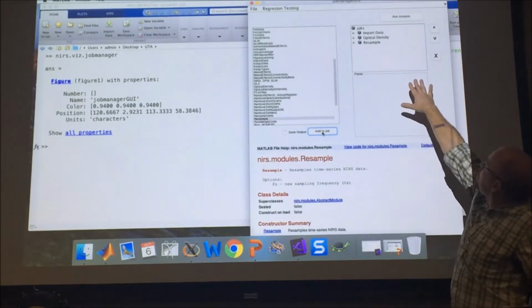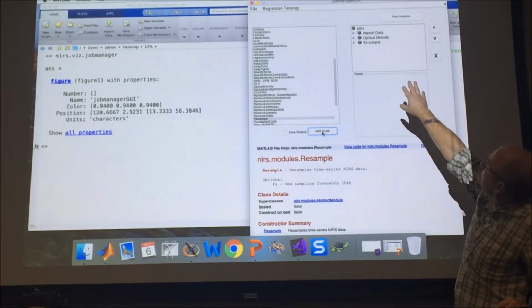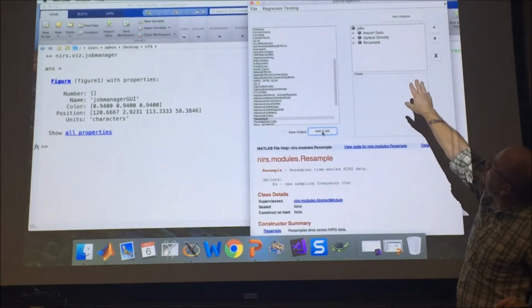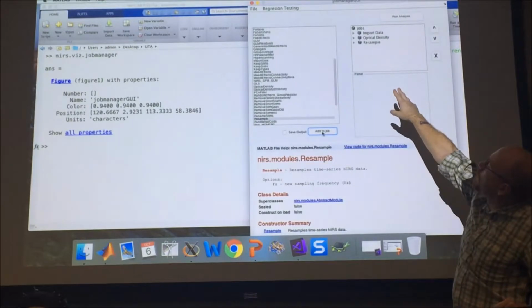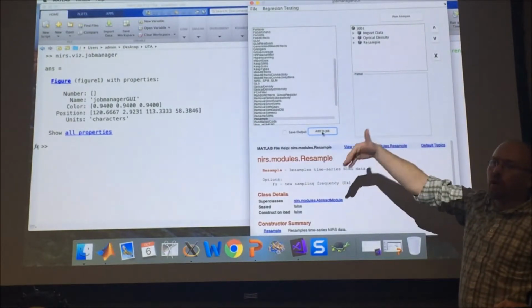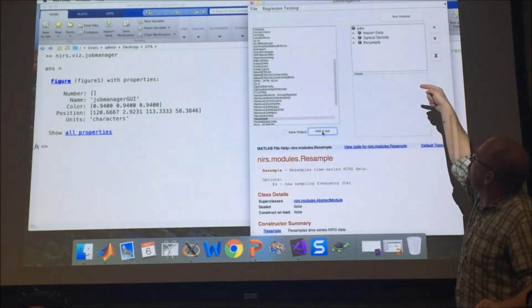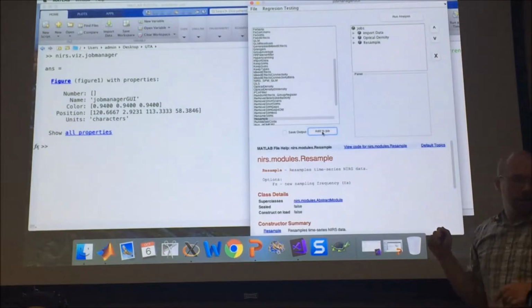So over here, it's creating my pipeline. My pipeline is first going to be import data, run the optical density, and then I had the second job of resample. So it's going to run those all in order. If I say job.run and give it the raw data, the data I loaded, it's going to run those set of 3 jobs in a row.